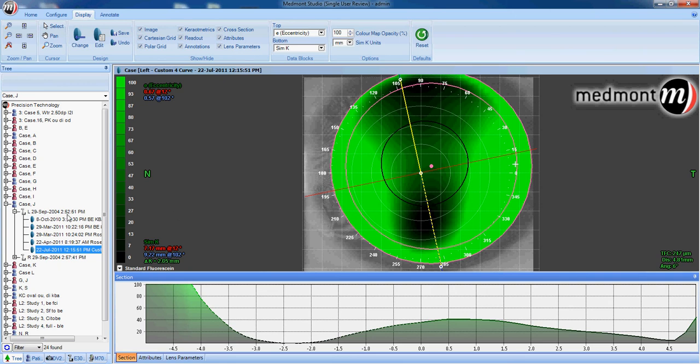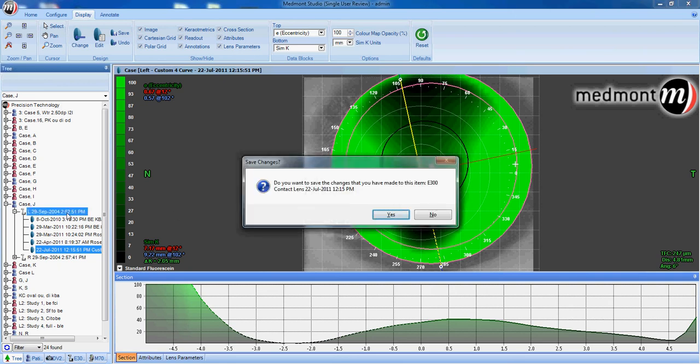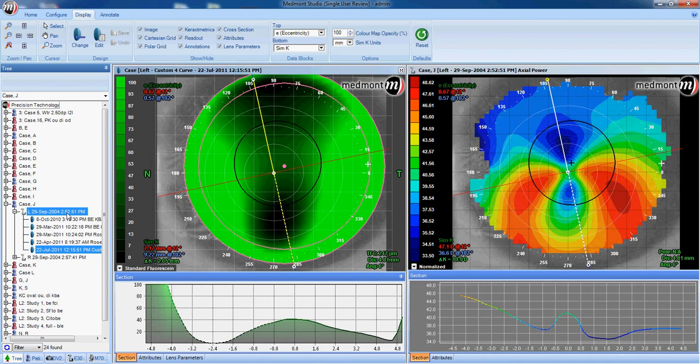This concludes video 10 on the review of functions and usage with your Medmont E300 Corneal Topographer.